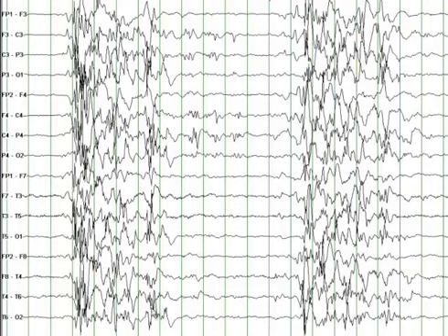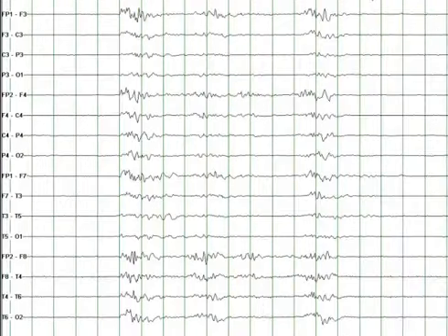One of the typical features of the burst suppression in this syndrome consists of bursts that last from 4 to 6 seconds. These have this kind of a morphology with delta and theta activity intermixed with spikes and sharp waves, and periods of suppression lasting for approximately 4 to 6 seconds. Now I will show you an example of a person with burst suppression resulting from anoxic brain injury.